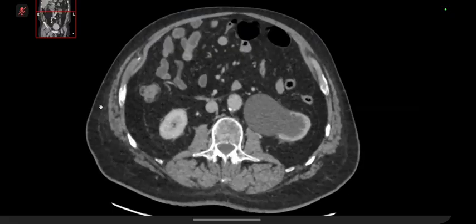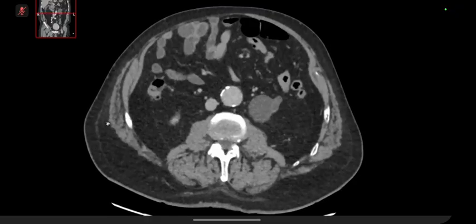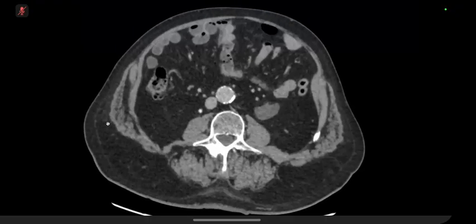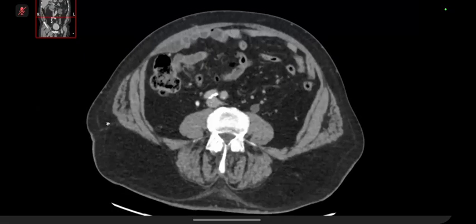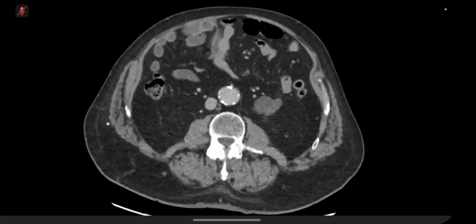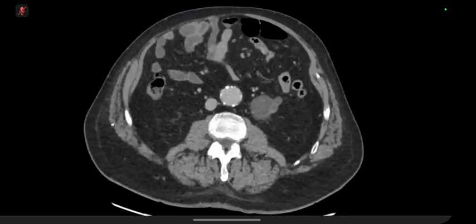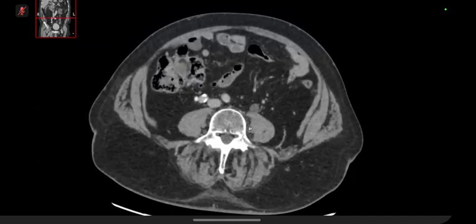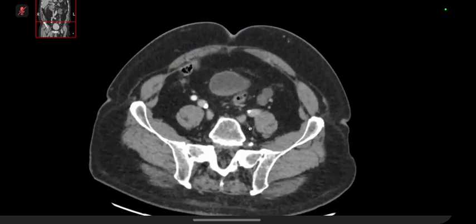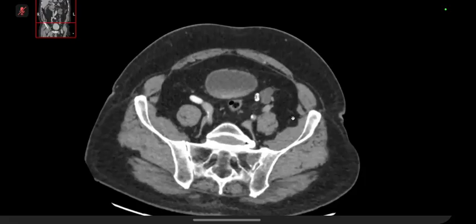Pseudo, what did you say? Pseudodiverticulosis of the ureter. Yes, sir. Because I think these cystic outpouchings are in the wall of the ureter, I suppose. Where is it? So these ones, this. Trace them, trace it. Okay, yeah. So this could be a tortuous part of the ureter as well. But I saw this thing in the lower part as well, like here. Please keep tracing the ureter.